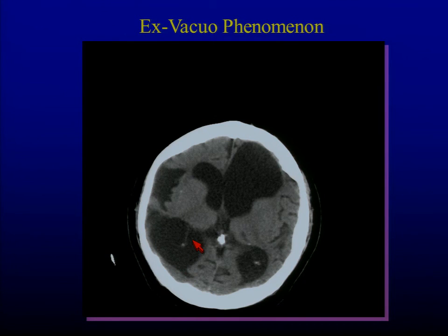I will tell you this kid's ventricles are way bigger than those last two kids' ventricles. Huge left frontal, huge right occipital horn. But look at the Sylvian cistern on this person. Look at the gyral pattern. So big ventricle does not mean hydrocephalus.